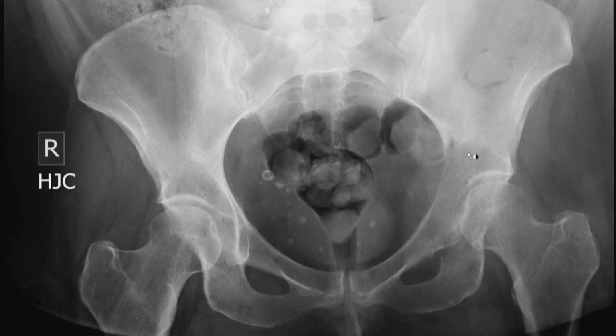There's no well-defined zone of transition between the osseous lucency and adjacent normal bone. There's no associated mineralization. These features are consistent with a biologically active and aggressive tumor. Loss of the ilioischial line places the epicenter of this tumor in the posterior column of the acetabulum. There's no radiographic evidence for pathologic fracture.